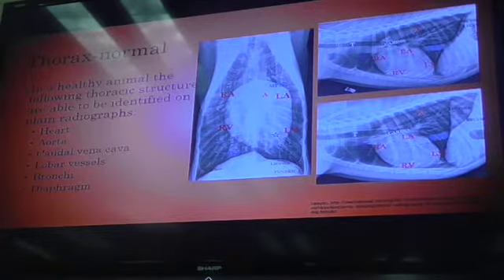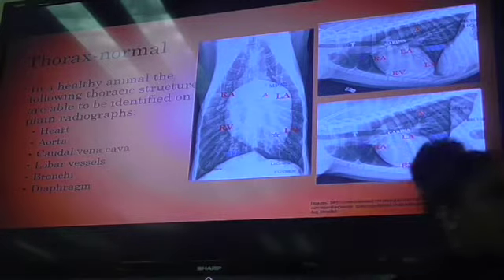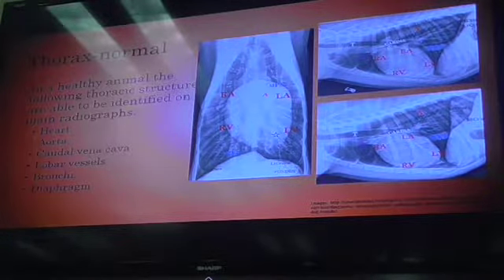All right, so there goes my little labeling that I did. And so these are some of those important structures in which we're looking at. Can everybody make out this star? No, it's kind of small. But that star is right over the cardiophrenic ligament.